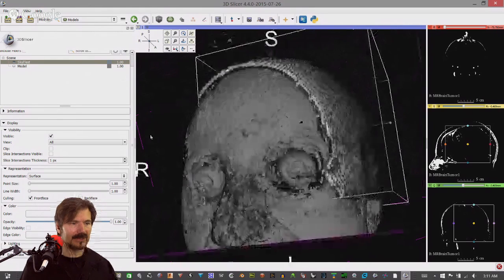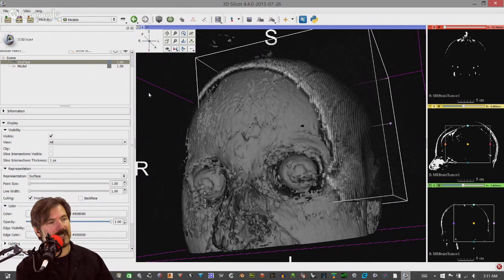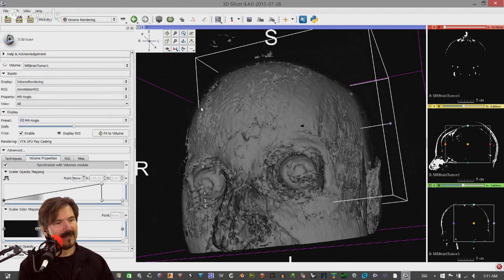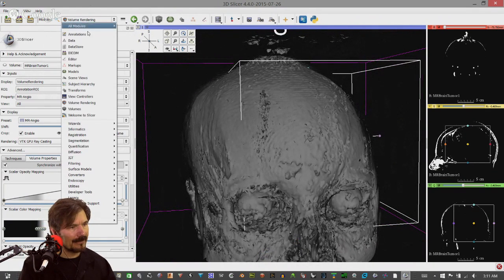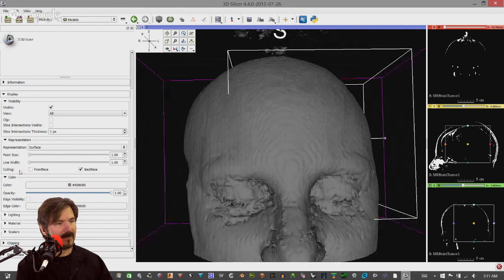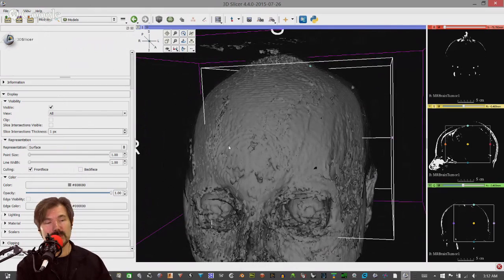And notice how I've got this region, and the reason that you're still seeing this. What else do I still have on, Javin? Let's see. Well, I'll save you a little time. I still have the volume render on. So notice when I reversed, let's go back to the model, when I reversed the culling process, it actually removed the front surface. So there's actually two layers there.